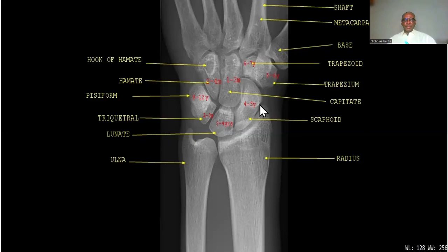Subsequently, you'll see that the ulna is smaller, whereas the radius is broader. The radius is actually the one that takes part in the wrist joint, whereas the ulna has a fat pad around here that helps to cushion the effect of the styloid region. The lucencies we are seeing in this area show that these are joints.